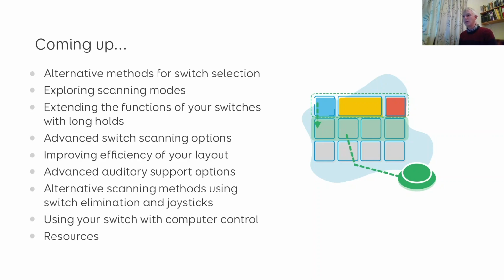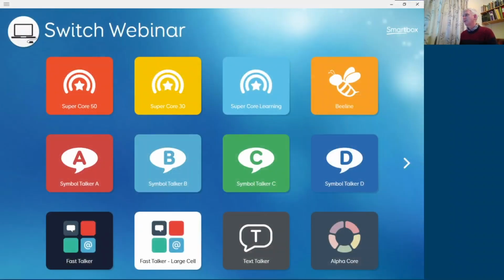So I'm going to switch now to Grid. So let me just transition to that. So hopefully now you can see my screen, and you can also hopefully see me in a window as well, which I'll use to demonstrate how I'm using switches in just a second.